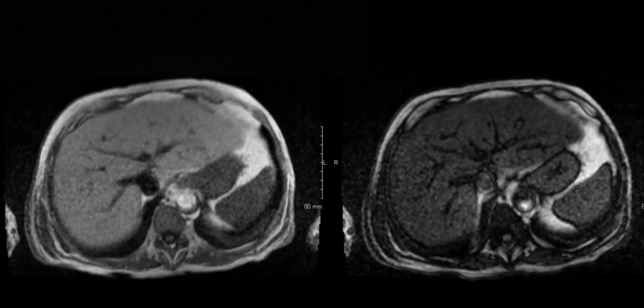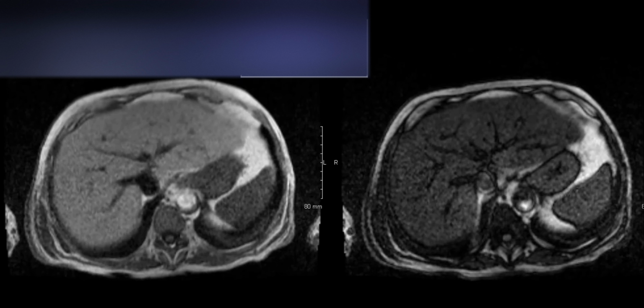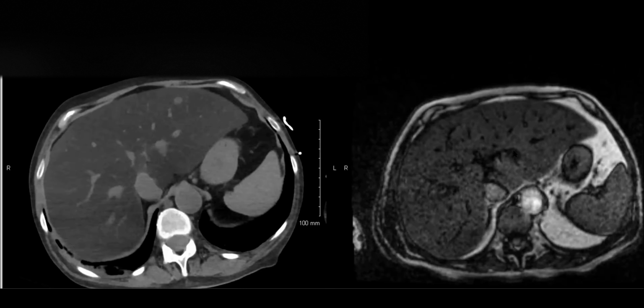There isn't a fat-water interface at the liver. The liver is so fatty that, as far as MR is concerned, it is all fat. So this is extreme steatosis.